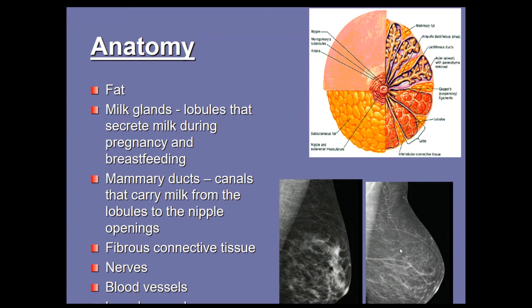Inside there are also some white soft tissues. These are the remaining milk glands, or you can say the glandular part, the fibroglandular part of the breast. On the other hand, if you see this X-ray, again this is skin. Inside there is again this gray area.